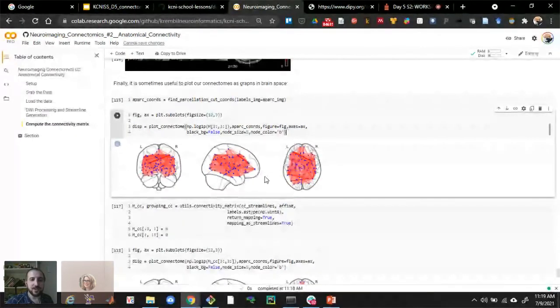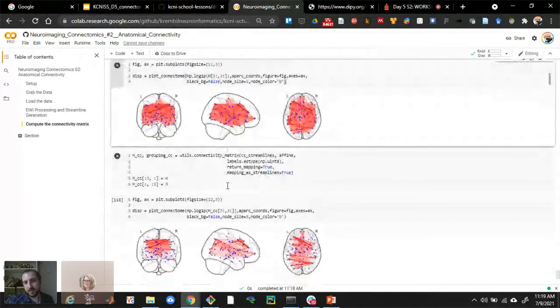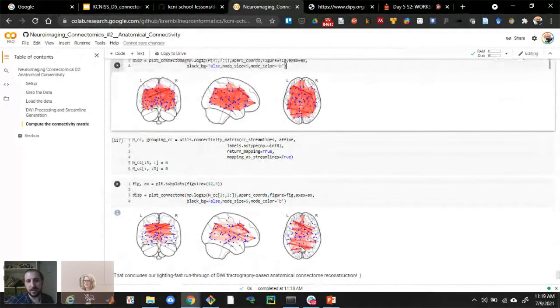Sometimes there's a structure that you can see in 3 dimensions in this kind of way, but often, especially when you have very dense networks, it's just blobs on blobs on blobs. It's just a mess, right? So what I did as a second pass here is pick out just the Corpus Callosum entries, and then plotted these in 3D. And this is a little bit more reasonable because it's not so crowded, and I can see to some extent that these are all left-right connections. That's where all these arrows are pointing.